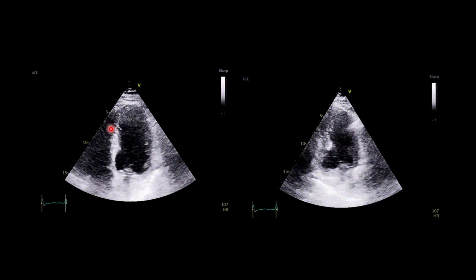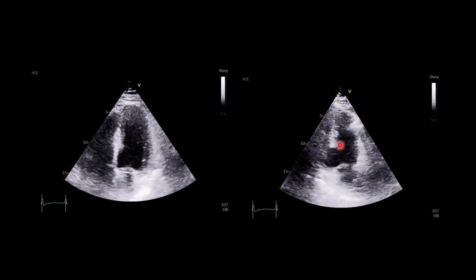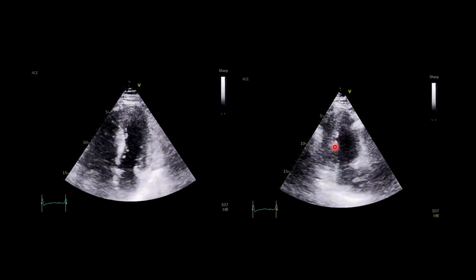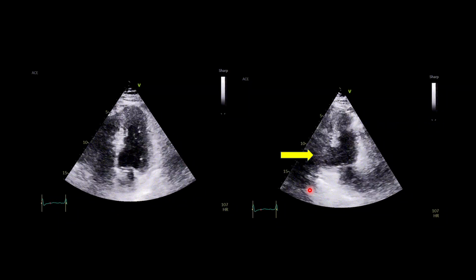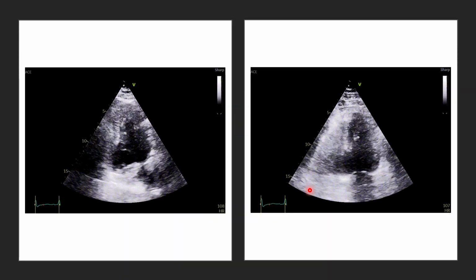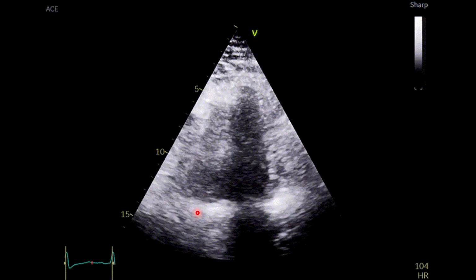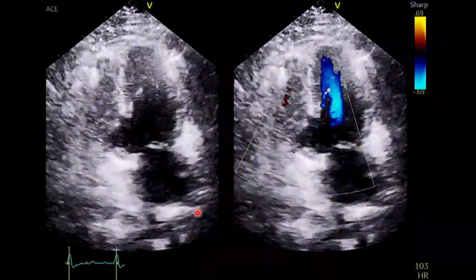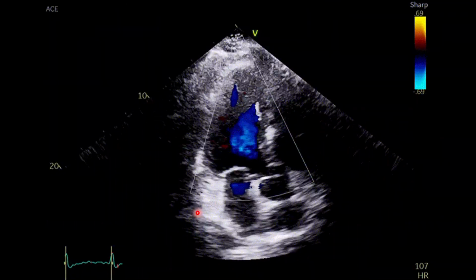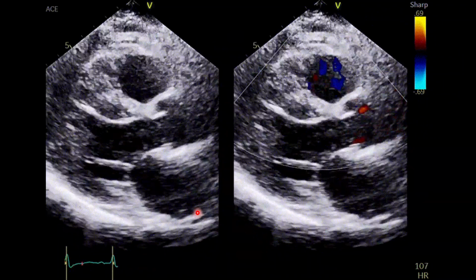The apical 4-chamber view confirms basal to mid inferoseptum, and the apical 2-chamber view confirms the basal inferior segment being akinetic. Some more views. So that's the akinetic segment we're talking about. However, on different views, we could not appreciate any color flow across the interventricular septum.